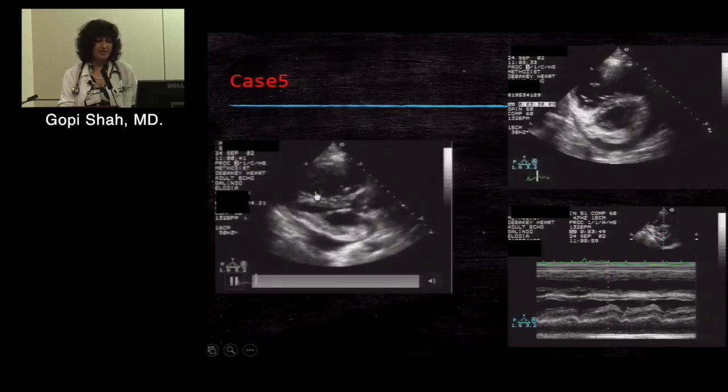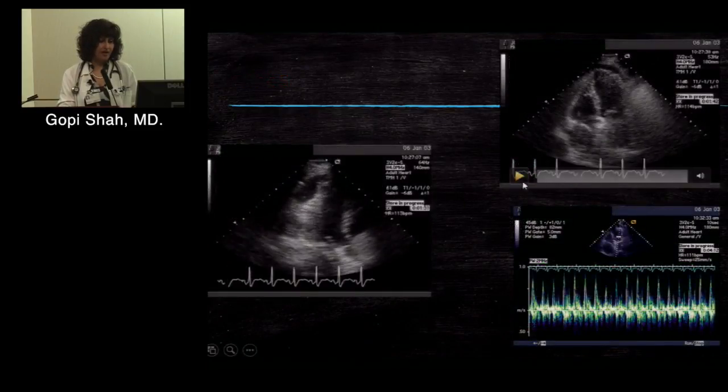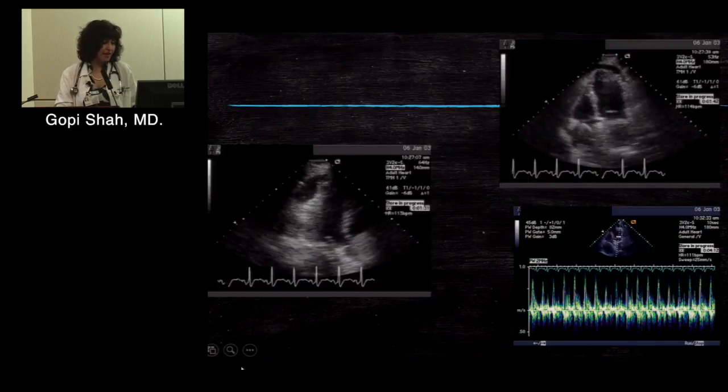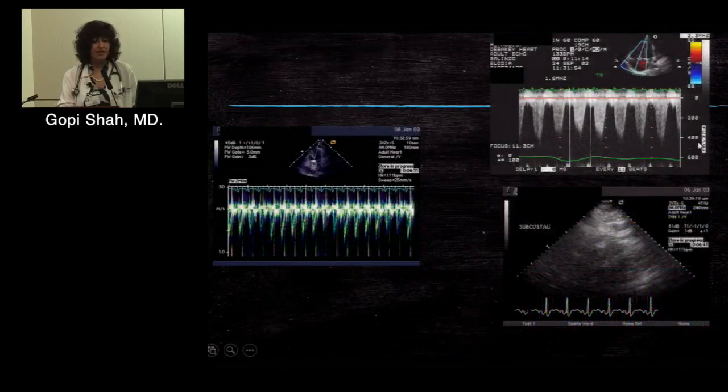This patient has a history of pulmonary hypertension, very high pulmonary pressures. There's a collection, you can see in the anterior too. But the chamber that is being most affected, and you can see it here also towards the apex, is the LV and not the RV that we traditionally expect, because look at how high the PA pressures are.